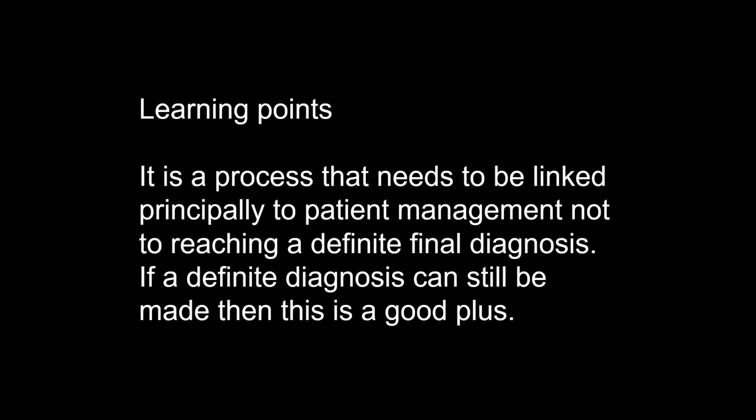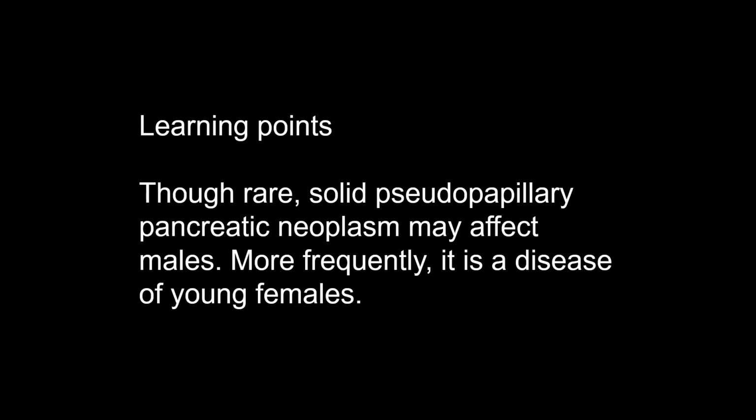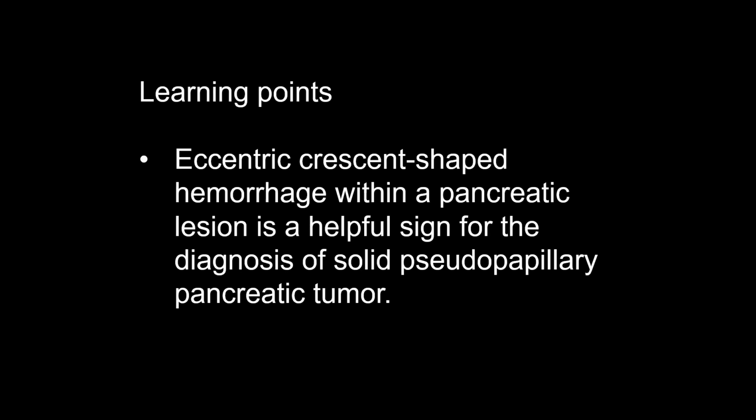If a definite diagnosis can still be made, then it is a good plus. Though rare, solid pseudopapillary pancreatic neoplasm may affect males. More frequently, it is a disease of young females. Eccentric crescent-shaped hemorrhage within the pancreatic lesion is a helpful sign for the diagnosis of solid pseudopapillary pancreatic tumor.